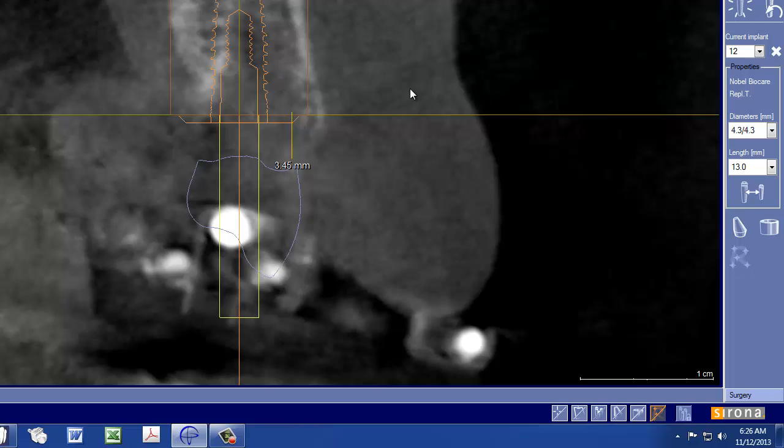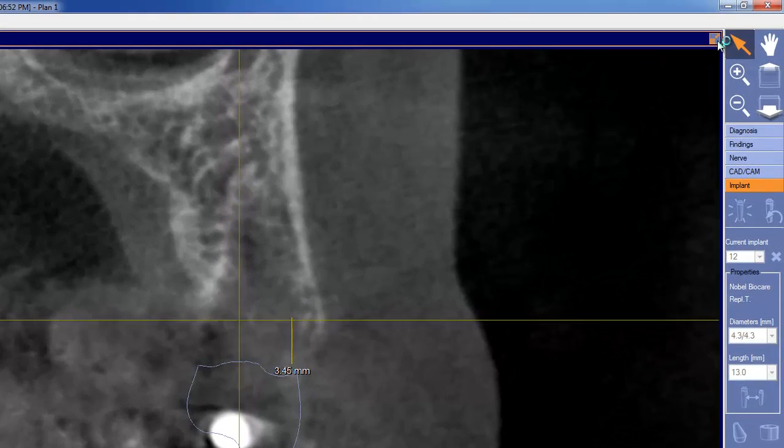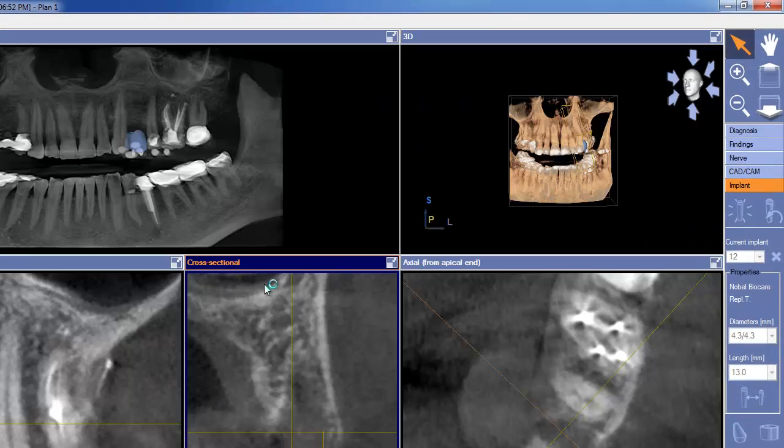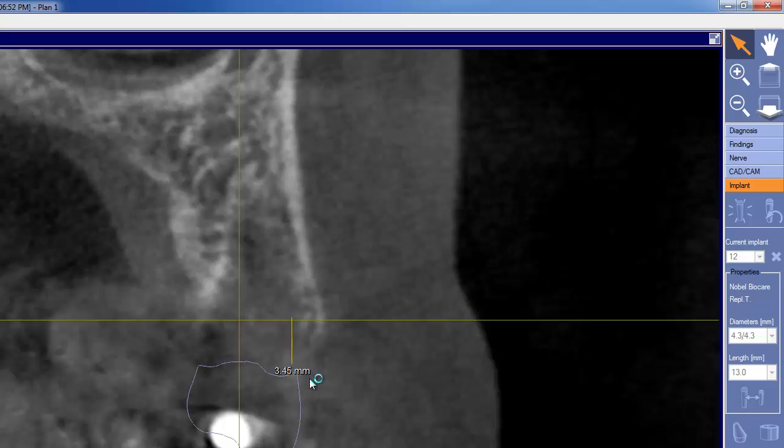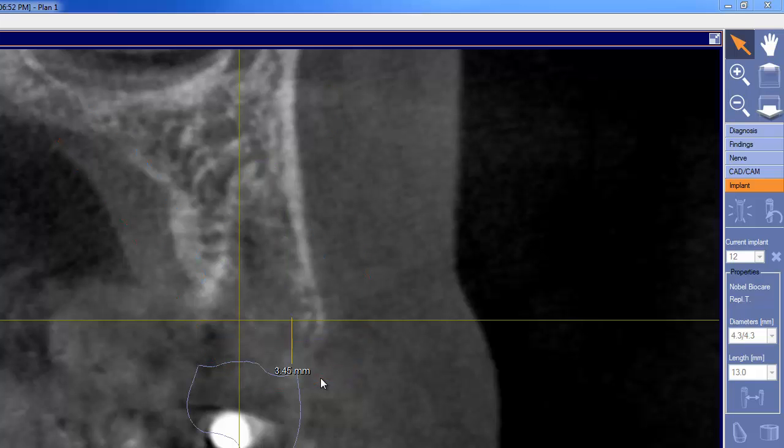Now, what I do want to take a moment to discuss here, and let me move the implant out of the way, is our CEREC design. I'm not saying that our CEREC design is incorrect. I'm just saying that I do have some questions about it. The reason I have some questions, let me bring my whiteboard back up here. And here again you can see our initial drawing. So let me go ahead and erase all of that. There we go, that is all gone now.